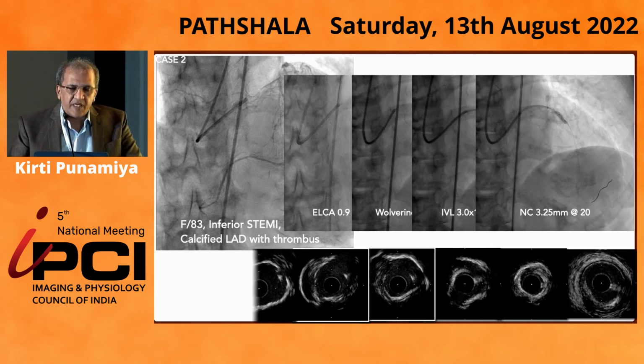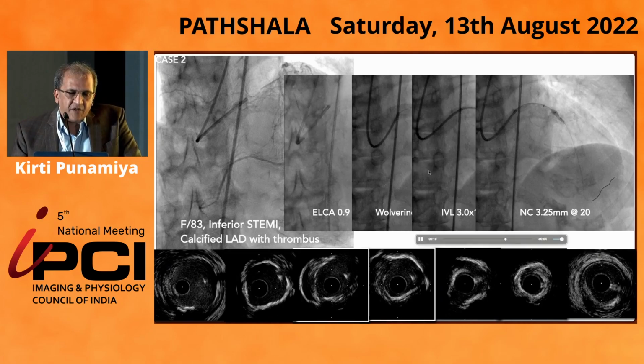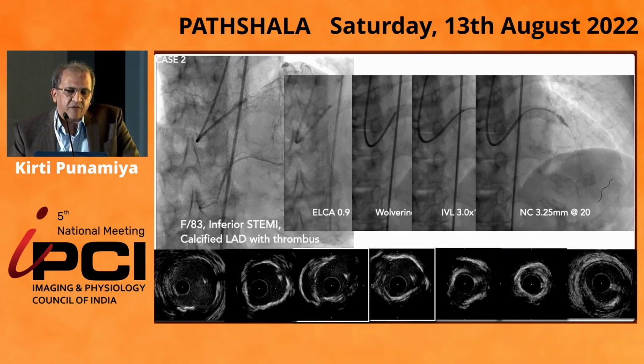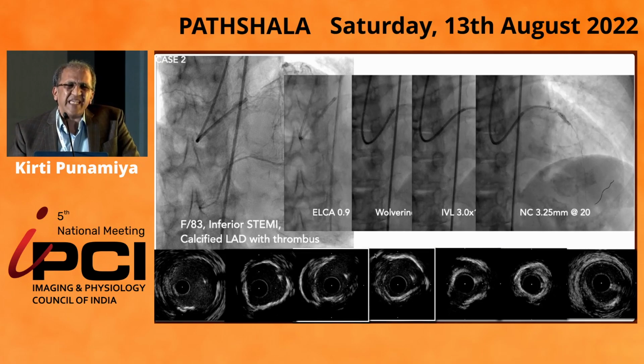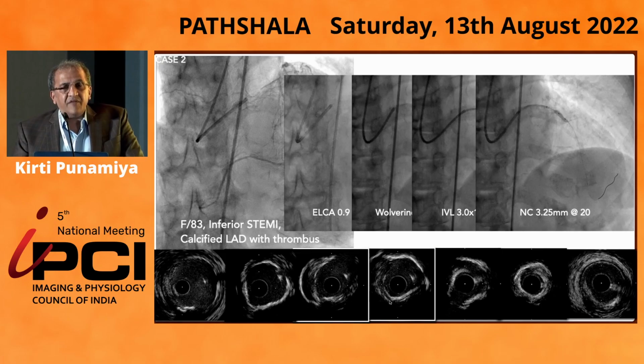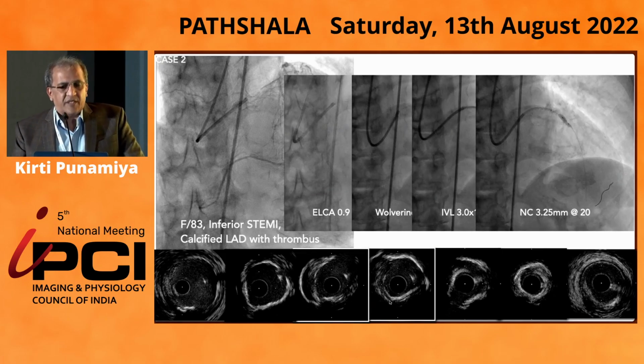So anyway, these were the IVUS images. And the images that we're talking about here is the branch, and this is just beyond that diagonal branch. So this is where we're facing serious under-expansion. And IVUS-wise, I mean, it looks quite innocuous, really.